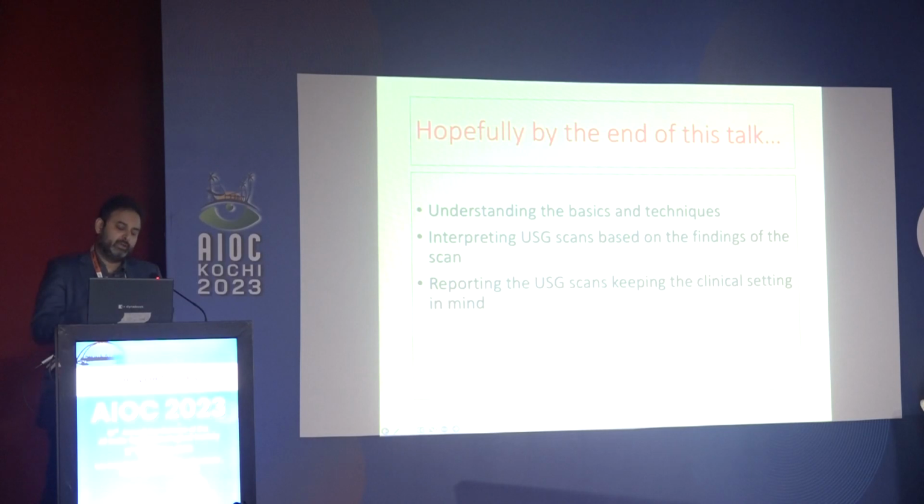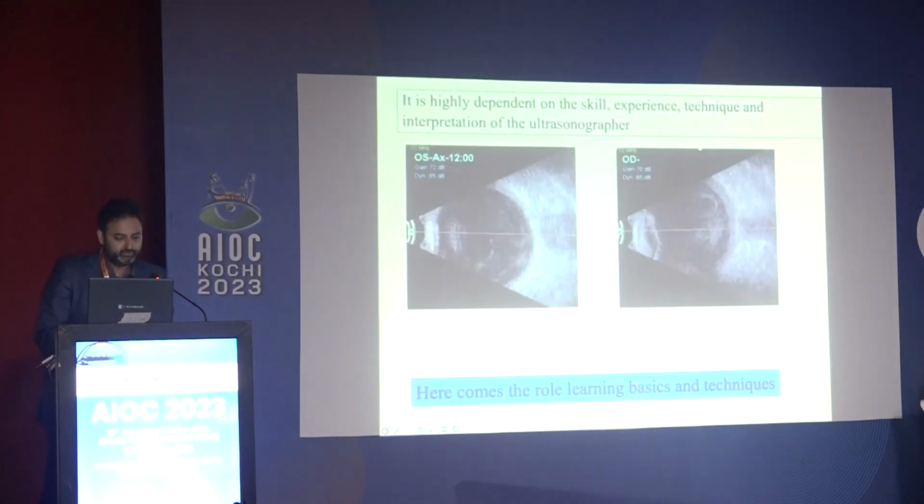I'm not going to get into an axial scan is this, a transverse scan is this. All of that is there in text, in literature. Let's just look at some of the practical aspects. How do you try and interpret an ultrasound scan from the broad general perspective without getting into minute nitty-gritties, right?